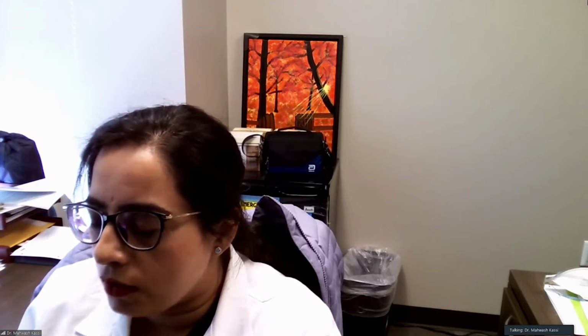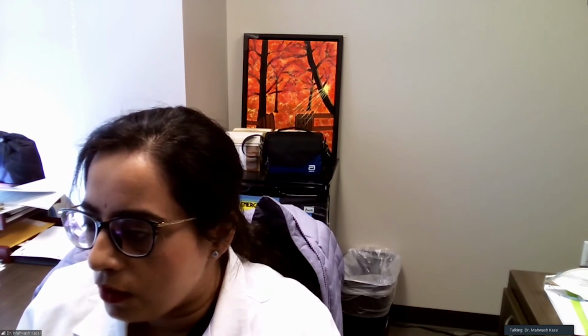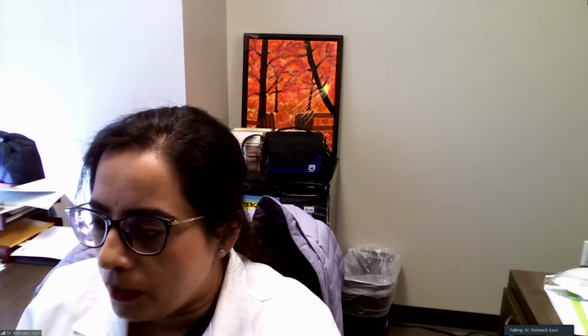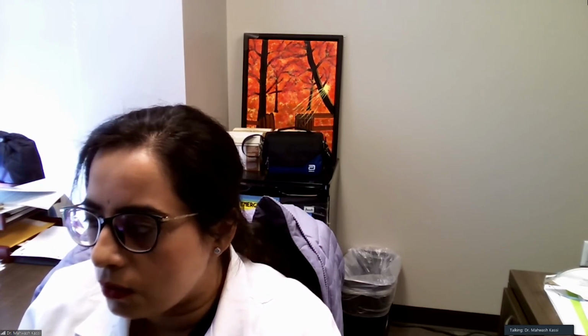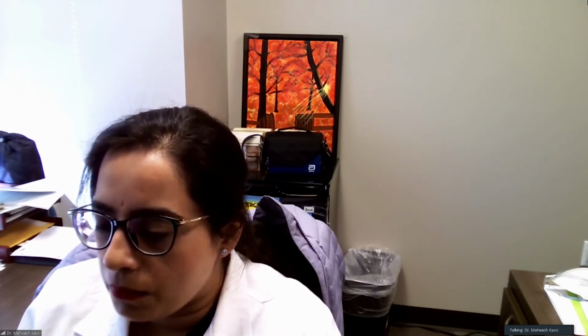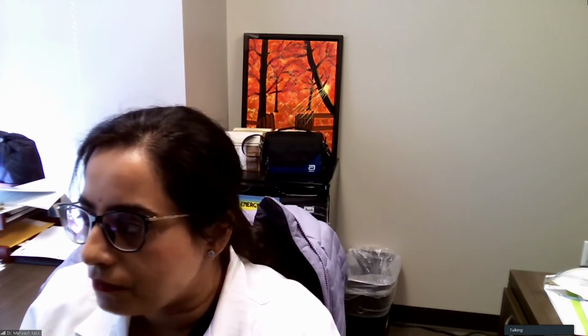And then we have, of course, a very good understanding with the CT department here. Dr. Chang has really led that effort to try to limit the contrast use and see if we can get images with lower contrast. But generally, in clinical practice, what I've seen, and we did a small study on this, is that it's well tolerated. They don't develop any contrast-induced nephropathy, and if we can limit or change the protocol of how the CT is done, which maybe you can mention more details about, Dr. Chang, they don't have advanced kidney dysfunction.